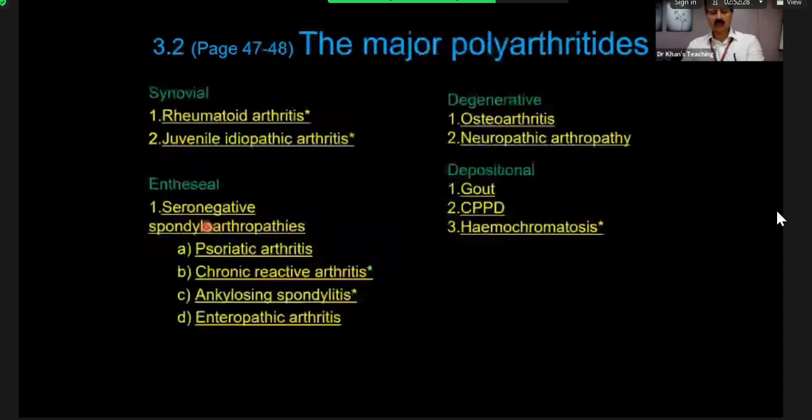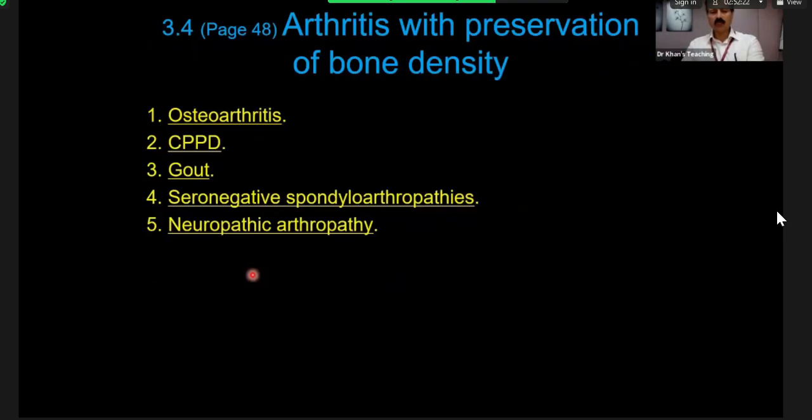But right now, the take home point is bone density is an important parameter to talk about in the exam. And bone density can be generally reduced, or it can be periarticular reduction of bone density. So this should be your pertinent negative or positives. At times in the exam films, because of radiographic factors, it becomes a bit difficult. You can say that, keeping that in mind, whatever your opinion is, and the examiners will correct you.